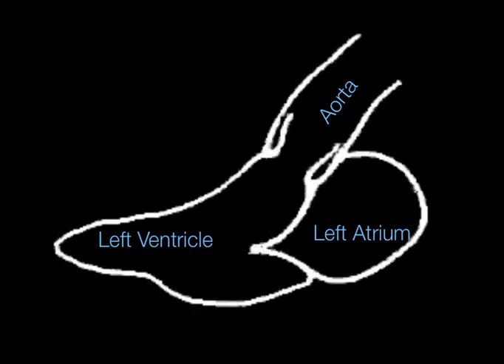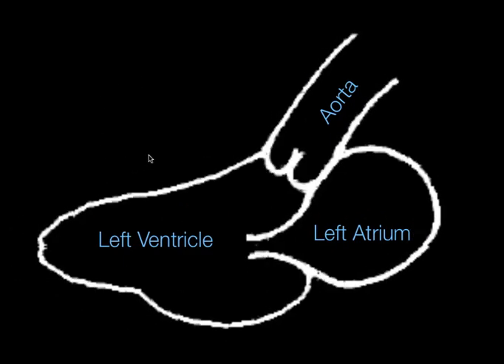And this is not an ultrasound. This is just a schematic diagram demonstrating systole and diastole. So when the heart squeezes, that's systole, it squeezes its contents out of the aorta, and out through the aorta, I should say. And during diastole is when it fills. And you can see that during diastole, the valves open and the heart fills with blood. And this is the septum seen here. And the right ventricle, not pictured, would be right up here, parasternal long axis.